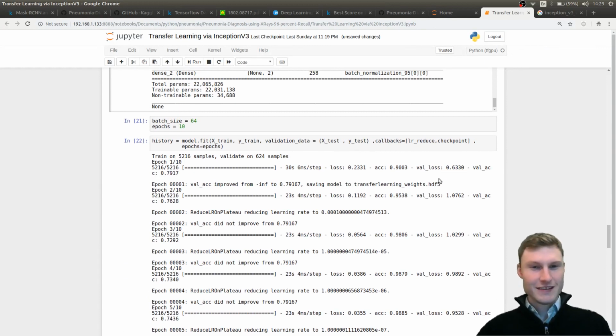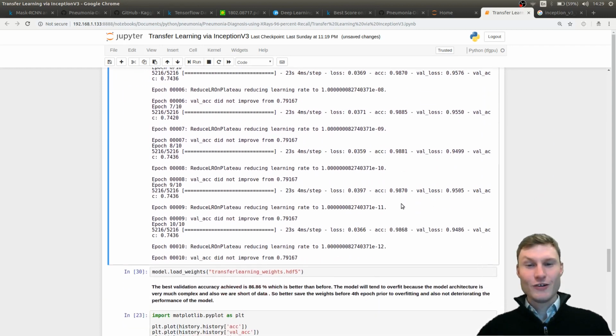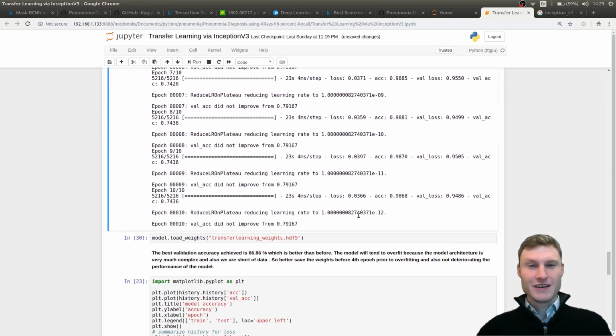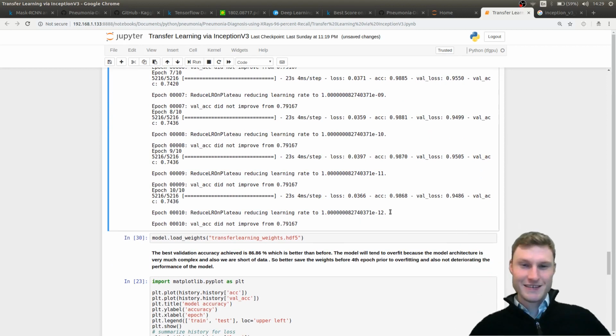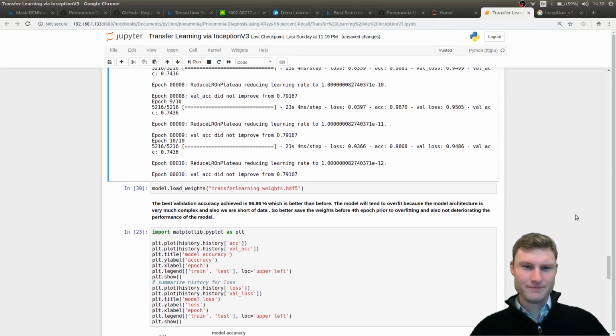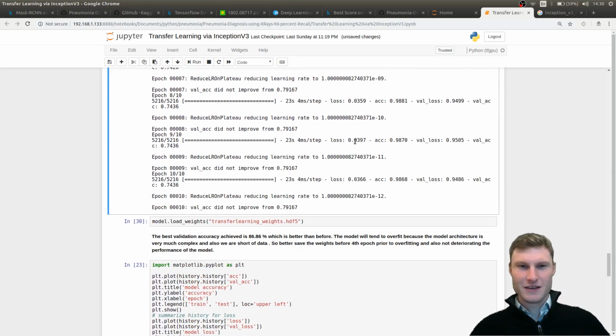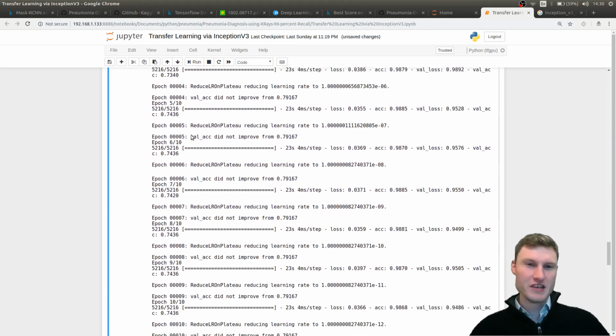It saved the weights in the first epoch, and it didn't in all of the following epochs. So this could need some improvement in the model definition. In essence, we need to change the learning rate and fine-tune some parameters, because basically we were waiting for all 10 epochs to run, even though it only uses the first.